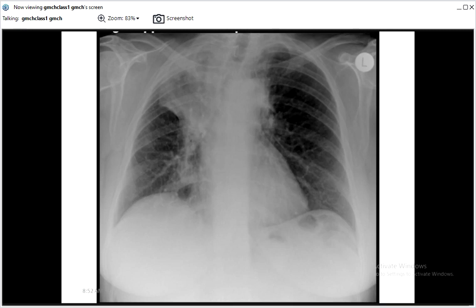Here again you can see in this X-ray. So this is a disease process. You will not see isolated findings. You will see many things in collaboration. So here you can see, can you make out the right heart border? No, you cannot make out. This is confluent with the surrounding lung tissue.